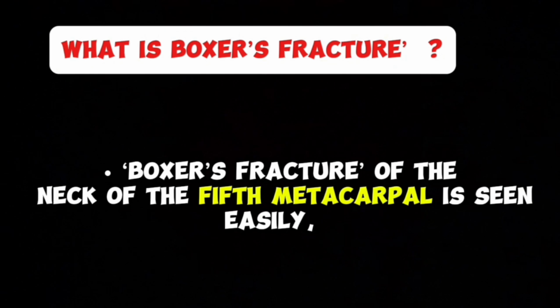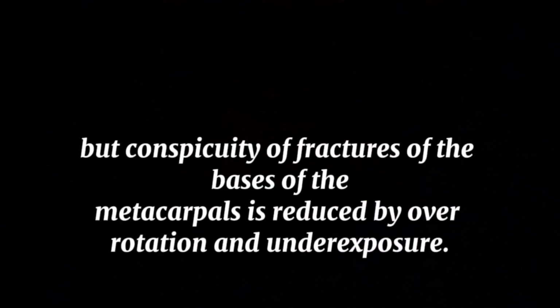What is boxer's fracture? Boxer's fracture of the neck of the fifth metacarpal is seen easily, but conspicuity of fractures of the bases of the metacarpals is reduced by over-rotation and underexposure.